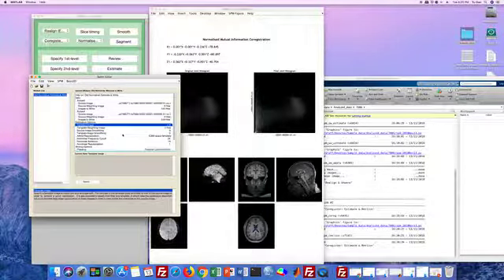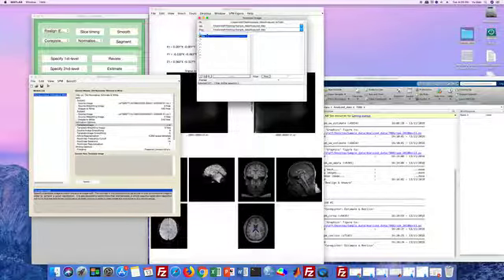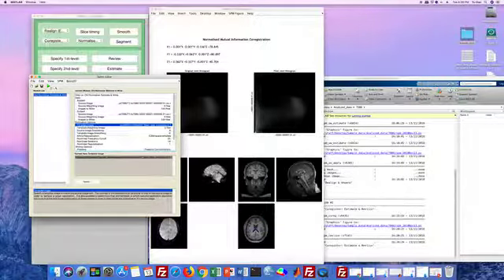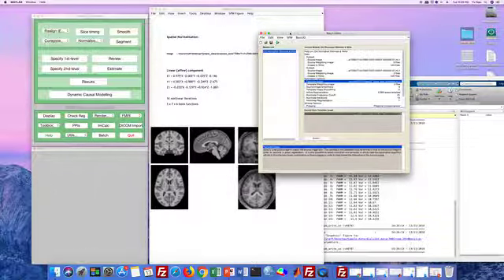Here we need to select the template image and then specify. Go to the sample data folder. Here you have a folder called template. Select this one. Done. Keep other settings as default. Run.